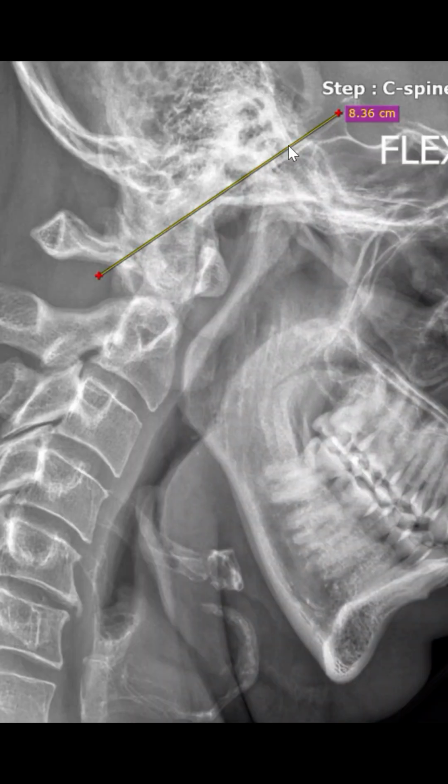And ask whether or not it can be done on X-ray, and I do want to say yes, it can be if the quality is good. And you can see the particular outer cortex of the skull bones here. So you have the empty sella right here of the pituitary gland, and you can see usually it wraps up, starts that occipital path going this way. You can see the little line, and you can usually see the end of the clivus right here. And if you got some good eyes, you can usually just get that there.